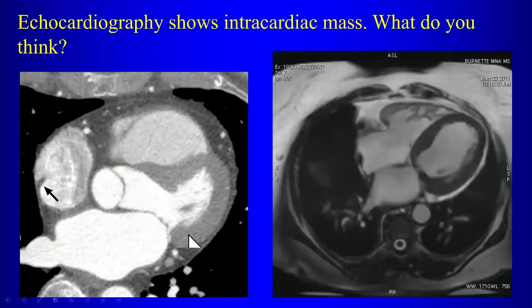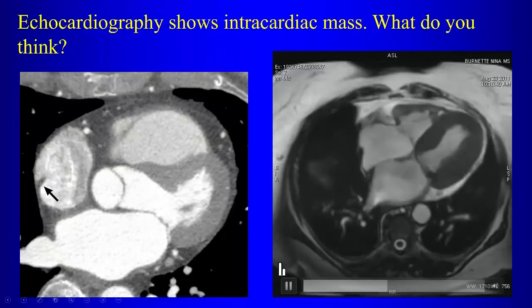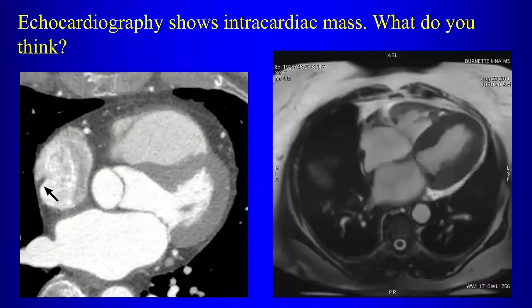And do we see the abnormality there on the MRI? Yep, so that's this area right over here. So what does that represent? Yeah, so louder so everybody can hear you. Are you next to the microphone?